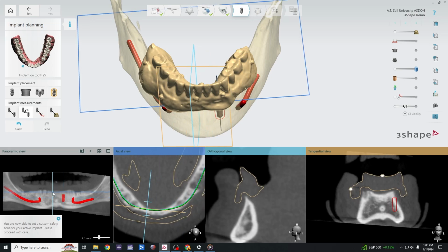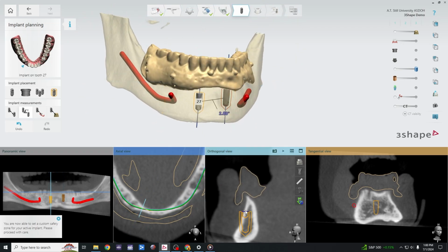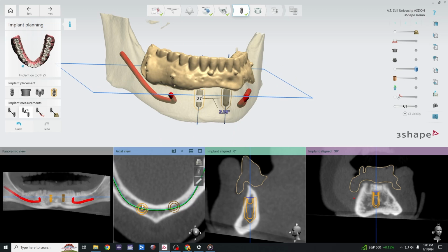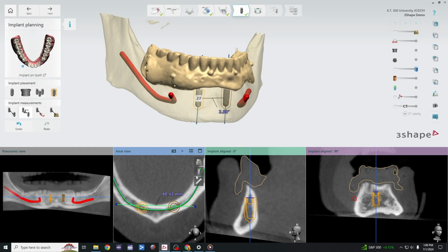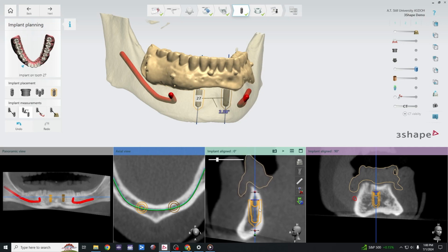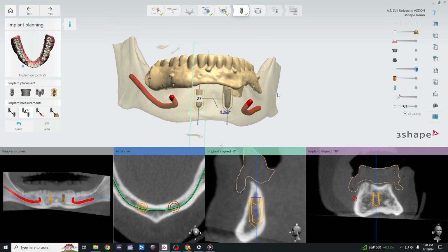And then now we want to go to canine lateral on the other side. So we'll go there for now. We'll set our orientation. And if we want, we can go to this view and keep things somewhat symmetrical. So we'll check the line here. Yeah, so that looks about right. So we'll go to this dimension here, or this view, and it looks like we got sufficient bone. So this area looks a little bit wider, so we're a little bit more flexible. Okay, so that looks good.